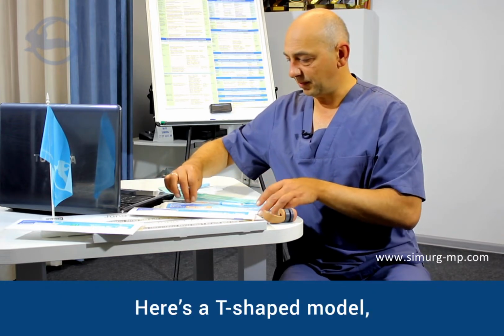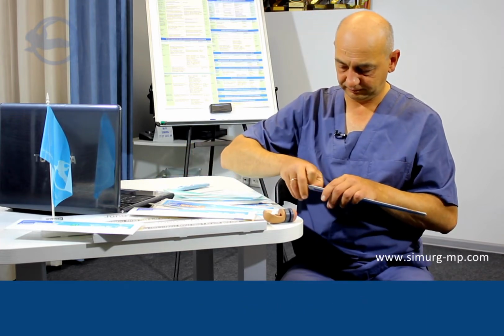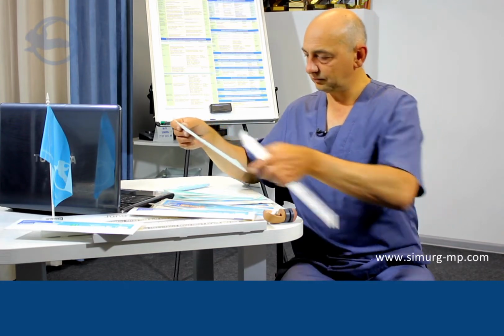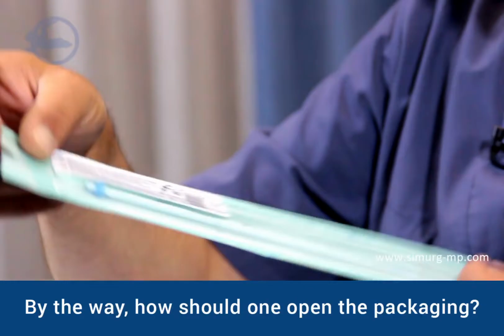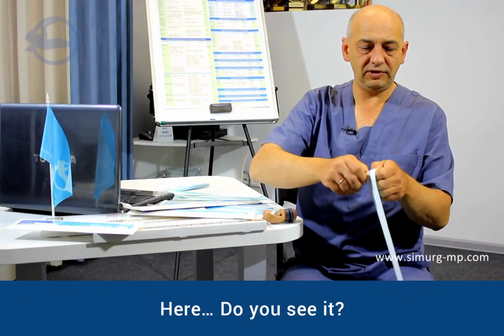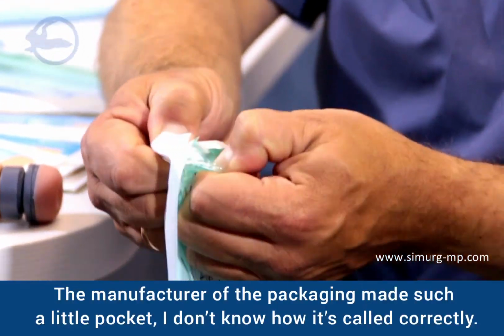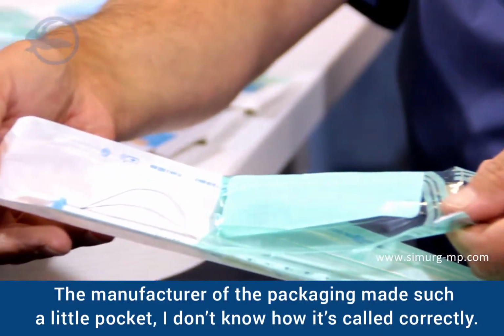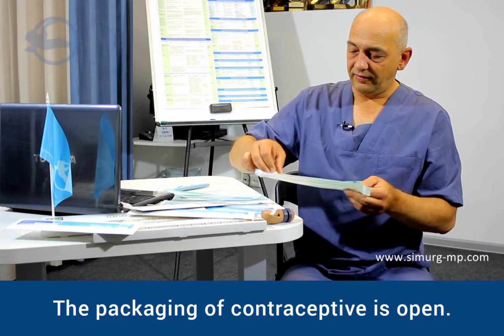Here is a T-shaped model. A plunger. By the way, how should we open the packaging? Here, do you see it? The manufacturer of the packaging made such a little pocket. I don't know how it's called correctly. The packaging of contraceptive is open.